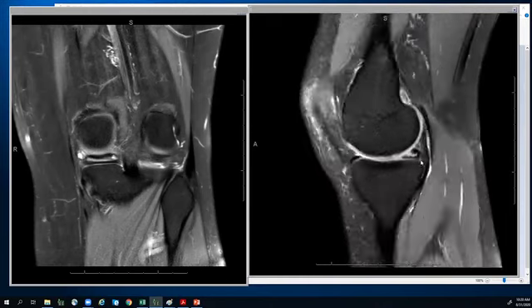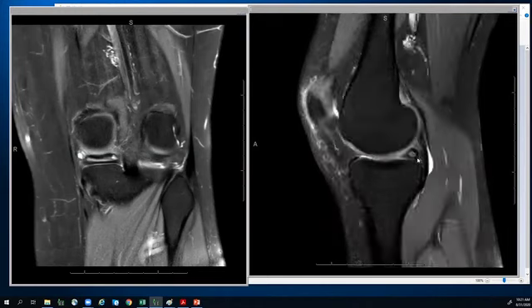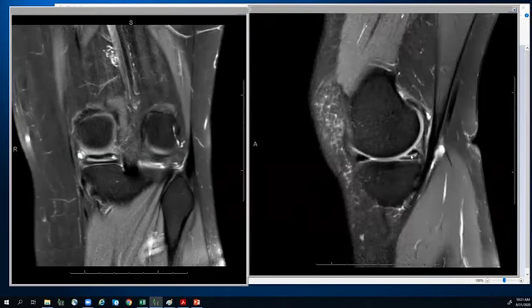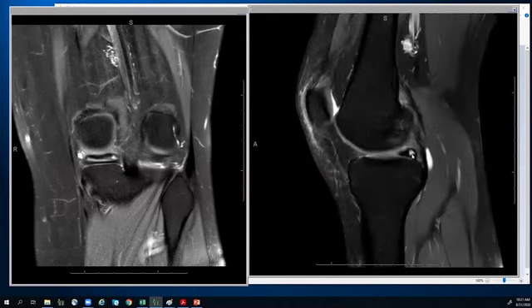And then another interesting observation is as I get closer to the root of the medial meniscus, I'm encountering what I would refer to as an intrameniscal cyst. So you could end up with these tears basically having fluid communicating to a parameniscal cyst, or the fluid can also communicate and basically deposit within the meniscus, forming this intrameniscal cyst located right here.